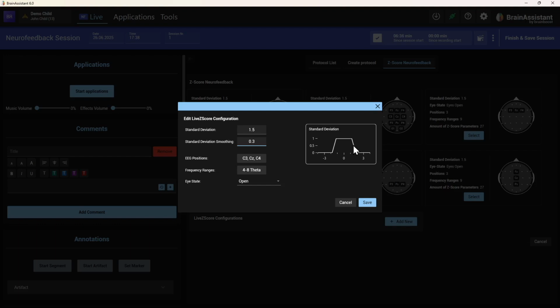Now it doesn't fill up with microvolts, of course. It fills up with: are you within this corridor, yes or no? And if I'm 1.8 away, then I'm just done, then I'm adding a 0. So then I'm actually outside. So with this smoothing, and of course we could go even more extreme, but this is kind of an extreme case, you can try around yourself. This means that when I'm approaching, I give more and more positive weight to the 1 bar. Am I inside the corridor, yes or no, filling up? So this is the idea behind the smoothing.